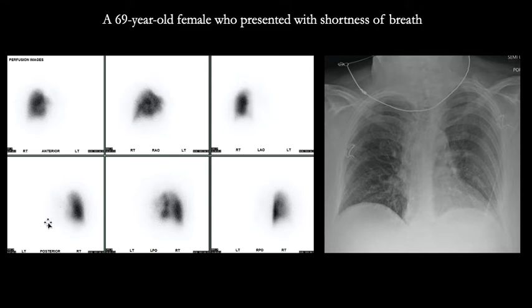And so what can be the causes of why there is no perfusion to an entire lung on the left side? And so when we compare these images to the patient's chest x-ray, here's the left lung. It is aerated, although it seems like the bronchovascular markings are prominent, so there may be congestion, but there are no opacities, pleural effusion, or pneumothorax.